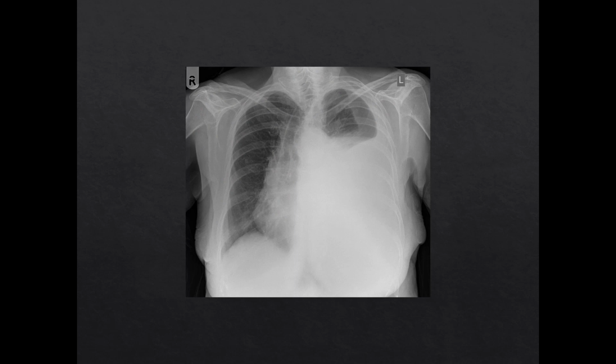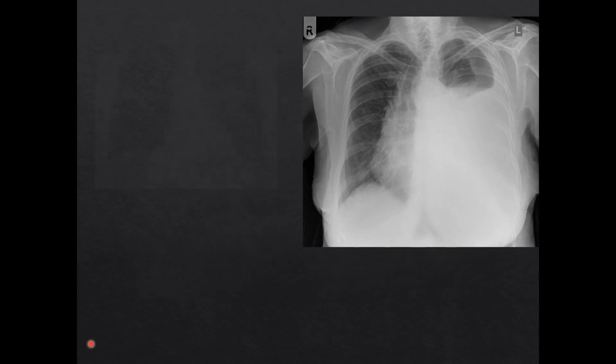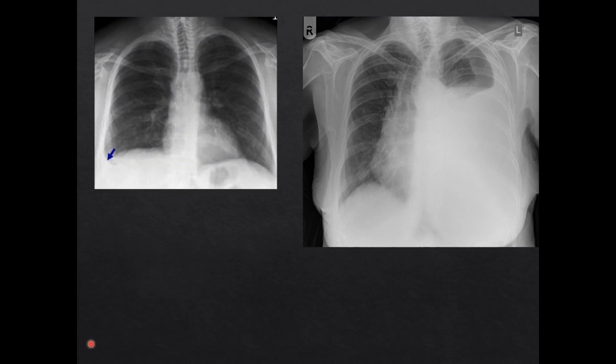So how is it that we do that? Well, for one, sometimes the chest x-ray itself can make the presence of a problem obvious, like in this film here. Other times, however, the effusion can be much subtler, like in the case of a PA or frontal radiograph, given that it takes a minimum of 200 to 250 milliliters of fluid for an effusion to be visible on this kind of imaging. In the context of a low volume effusion, you may only see a meniscus at the costophrenic angle in a frontal film, and in a supine patient, you may only see a diffuse haze throughout the lung field.